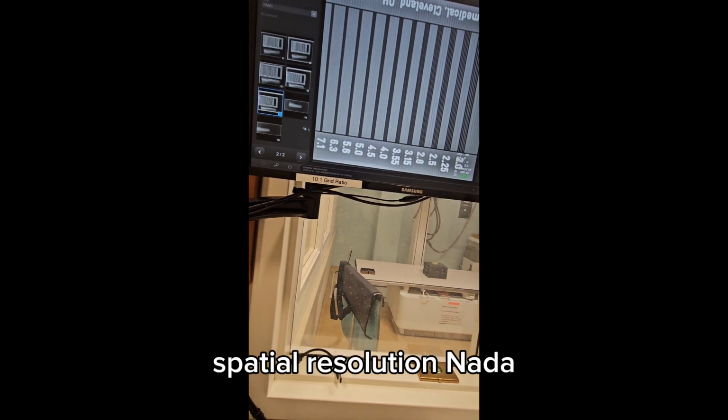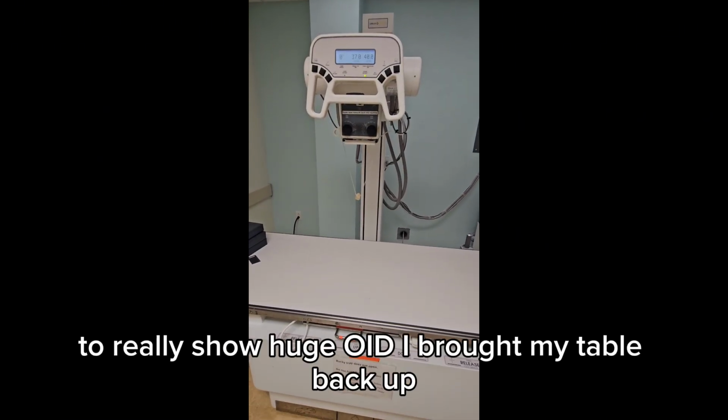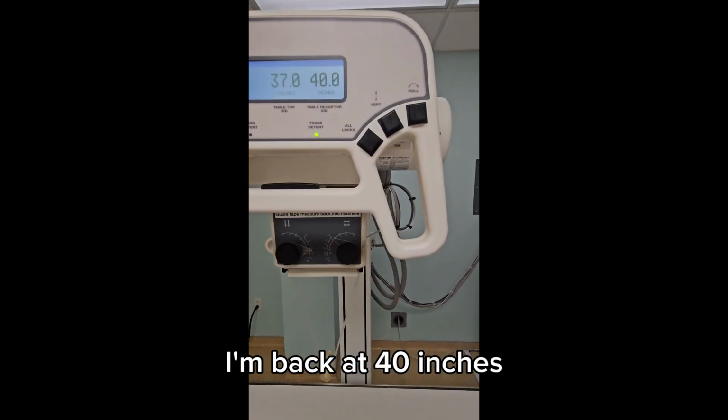Okay, so finally, to really show huge OID, I brought my table back up. I'm back at 40 inches.